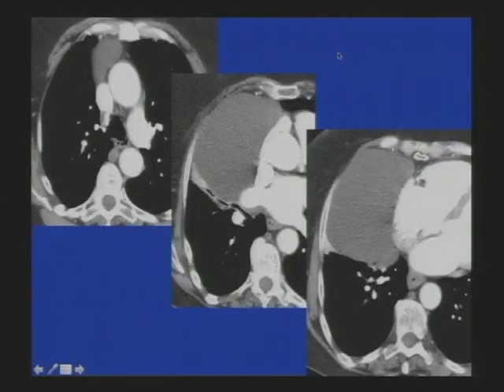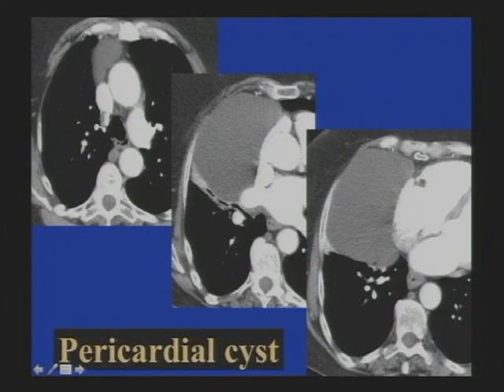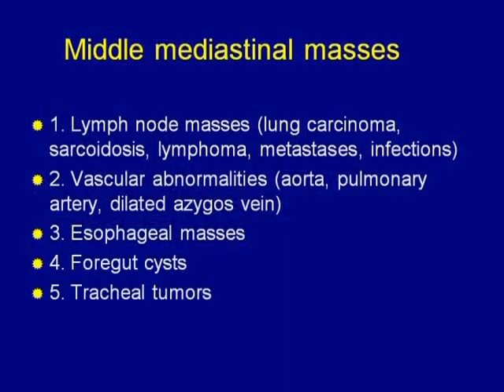This is the patient, homogeneously low density mass in the pericardiophrenic angle. I could put a Hounsfield unit number on that, and the whole thing was about 5 to 10 Hounsfield units. No enhancing components, no thick wall, nothing, no complexity to it. You don't need to do anything about this. This is a pericardial cyst or whatever, some sort of congenital cyst. Classically in this location, pericardial cyst. CT is diagnostic in this case. So that's anterior mediastinum. Let's move on to the middle mediastinum.